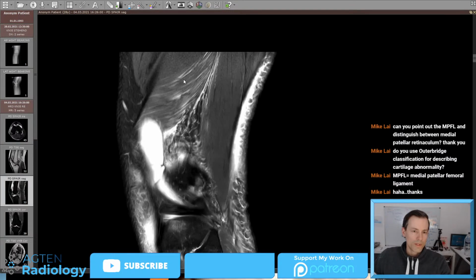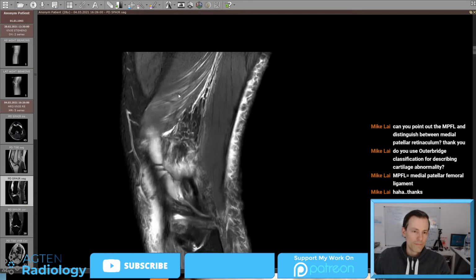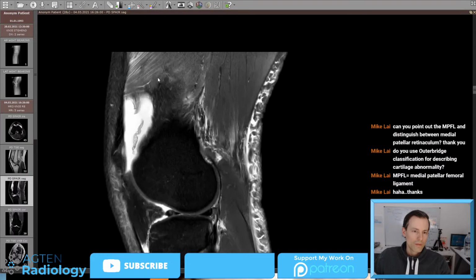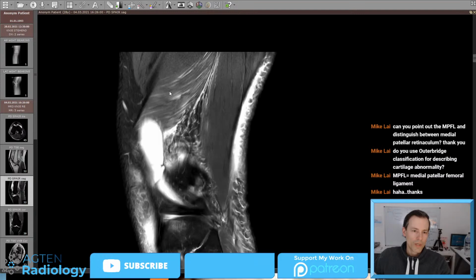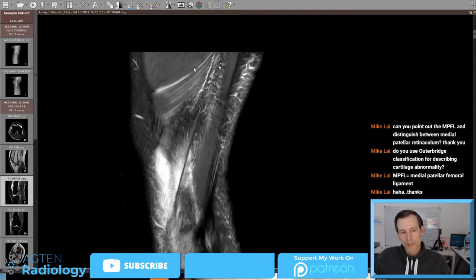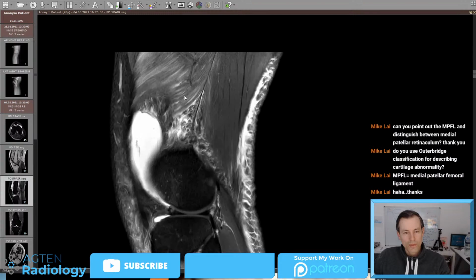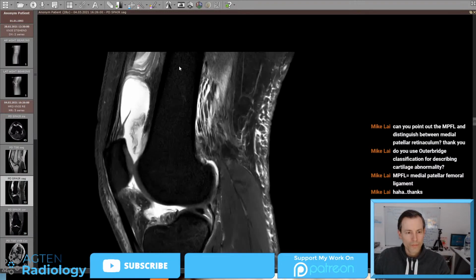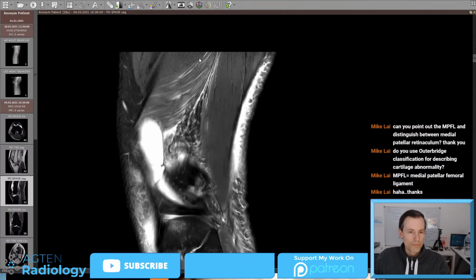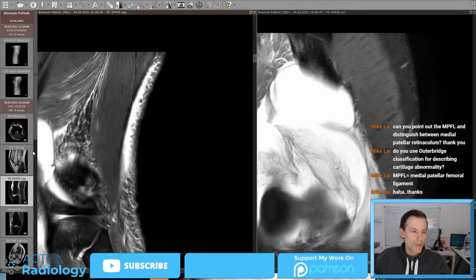Now you can see all this edema here. So even there was a relevant muscle injury. You can argue now, is the muscular architecture injured or not, but certainly there was a relevant muscle injury here too. So always give this a quick look.